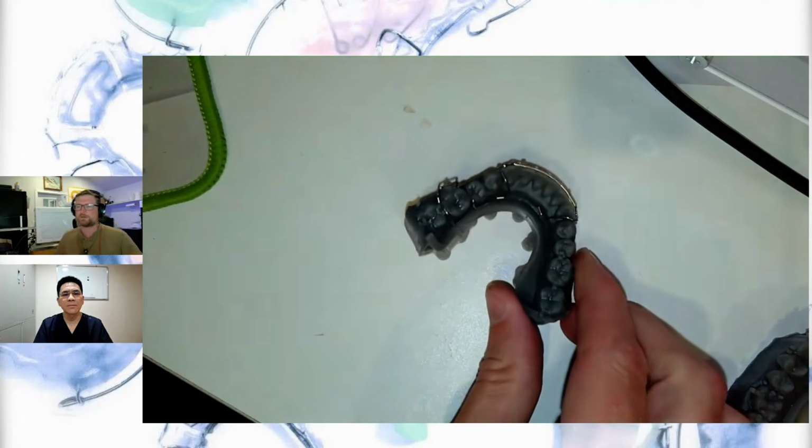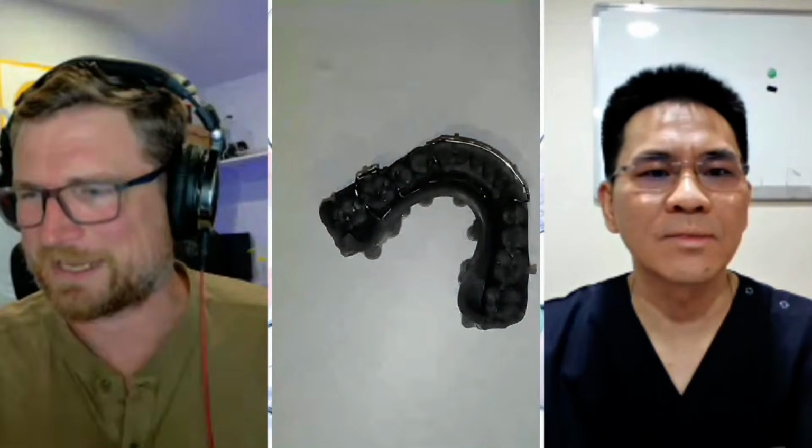So that's pretty cool. We got it together and exported it. We printed it, and then you can go and bend each wire, put it in the case pan with the wires, and then the models go in the case pan. I don't know if y'all use these, Dr. Neal, but I like it because it keeps it all together.